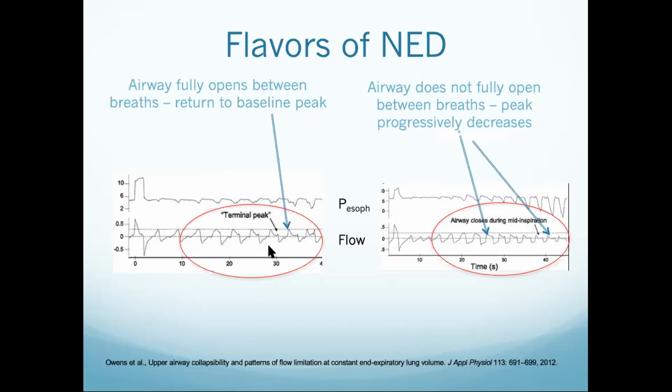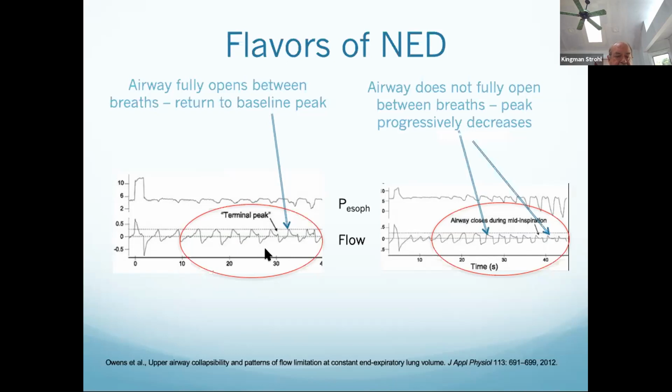There's a sharp increase in the effort? I'm not sure. No, if anything, the effort is less. See on top there, that effort is less at that point.